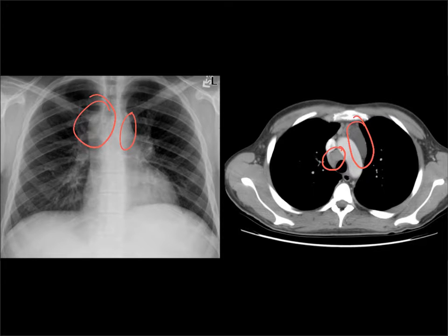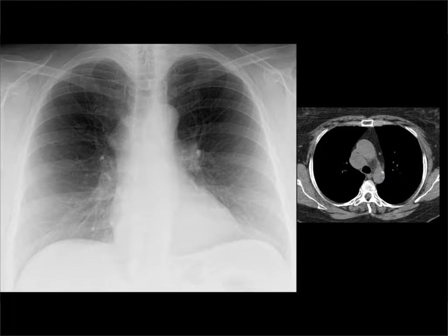And on this frontal chest radiograph, it's really this which is going to catch your eye and make you realize that there is an abnormality there. That's probably more like 3 centimeters than 1 centimeter. Here's another patient who again has a big fat azygos node there. Here it is here. I forget what their primary tumor was, but this was metastatic disease.